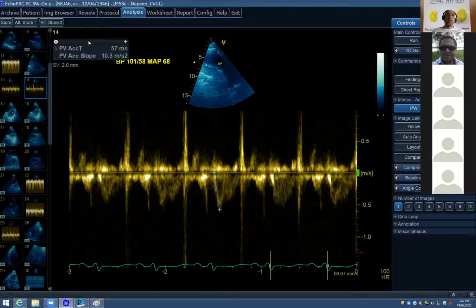Yeah, nice. So I think the 60-60 sign probably doesn't apply to this guy for that reason, because he's had previous pulmonary hypertension. And now with this marked change in his RV function, we ended up actually doing a PE study on this guy and he didn't have any PE. So I think this was all done because of the intubation and hypoxia and hypercarbia and reflex pulmonary vasoconstriction.